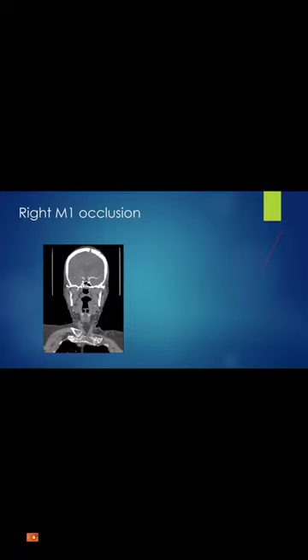So it's good to look at the thick slabs in coronal, which give you a thicker collection of slices that lets you see the artery confidently. The artery on the left is doing well, the artery on the right is gone, or there is a partial filling defect causing severe focal stenosis.